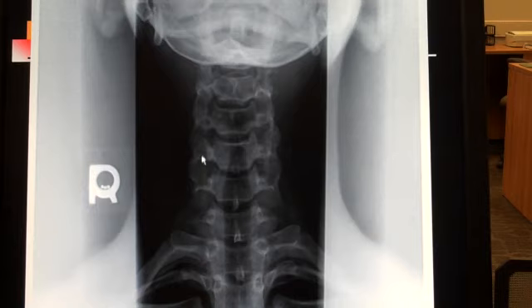Now, articular pillar, articular pillar, and you don't really see those through the zygapophyseal joint. The reason that it's difficult to see that joint space, you see it a little bit on this digital, but it's still not a clear open space between two pillars, is because the facets are at about a 45-degree angle. And so you're not really able to look through the joint in this case, but these are all the articular pillars creating what is known as the articular column.